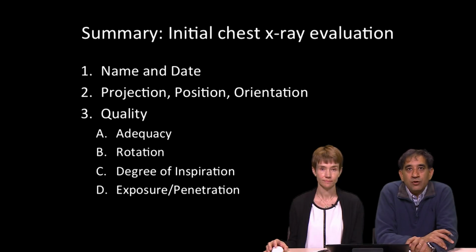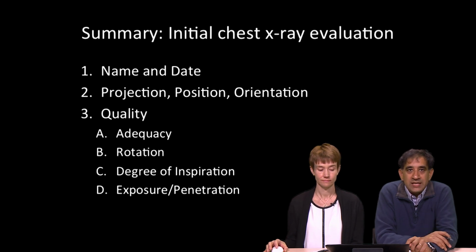In summary, when you're doing the initial evaluation of a chest X-ray, there are 3 steps that you want to take. Always confirm the name of the patient and make sure that's the patient you're interested in, and the date of the X-ray. Look at the projection, position, and orientation. And then in terms of quality, look at the adequacy of the X-ray, the rotation, degree of inspiration, and then the exposure or penetration.